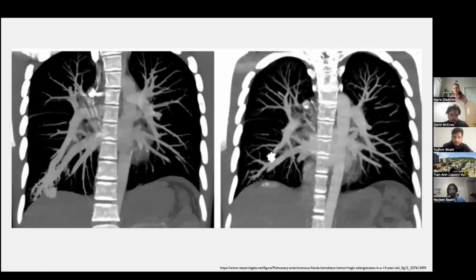And if you do a CT, this is a CT of a patient with an arteriovenous shunt fistula, and we see that there are pulmonary arteries and pulmonary veins going to and from the lesion over here. And then it was a girl with, I think, I can't remember, she had a syndrome.